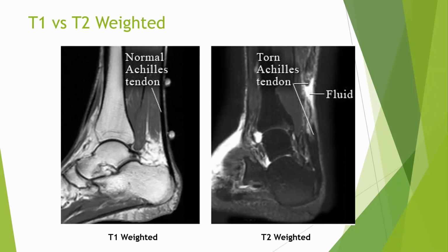And then you see what you need to see. If it's a T1, you obviously see more fat layer. If it's a T2, obviously if there is an edema or a trauma, you will easily notice it because it will be white or bright in color. All right, good. Okay, fantastic.